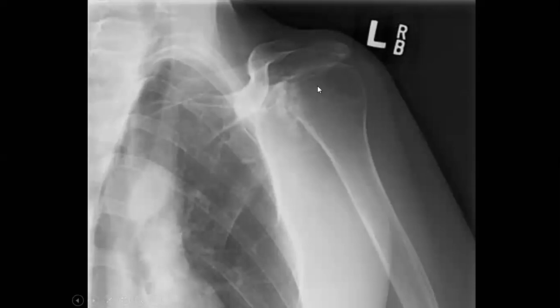If this is the humeral head, what is going on here? If you want to give a good description, what will it be? So you can see that there is some osteopenia here, yes, and there is something going on here with sclerosis, and possible erosion here. So if you find this, you mention osteoarthritis as a good differential on the X-ray with the narrow joint space.